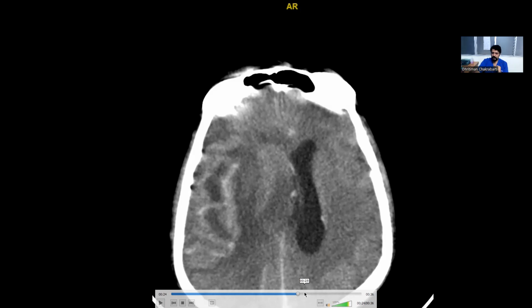Now, where is the third ventricle? You have got the two lateral ventricles on the side. They have an anterior horn going into the frontal lobe, a posterior horn going into the occipital cortex, and two branches which come out and go into the temporal lobe. So the shape is like this, going back and then coming to the front. This is what a ventricle looks like. In between, the medial parts of the ventricles are joined to form the third ventricle, and this hole is known as the foramen of Monro.